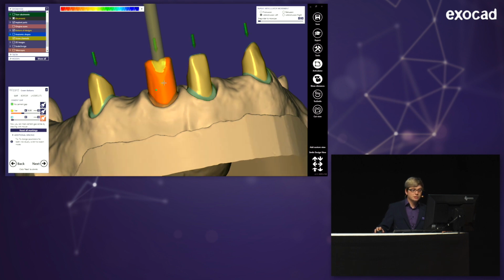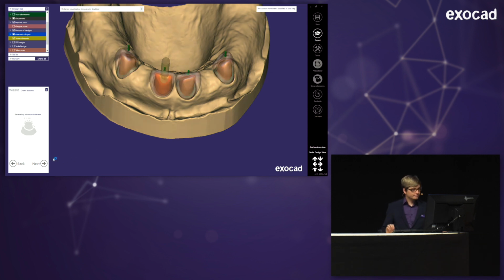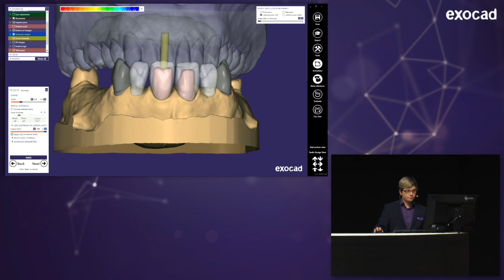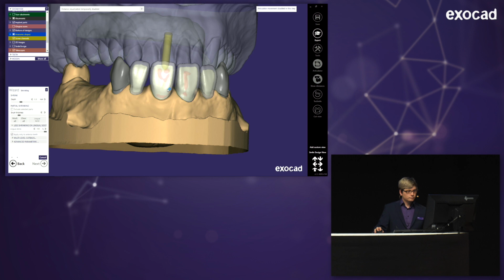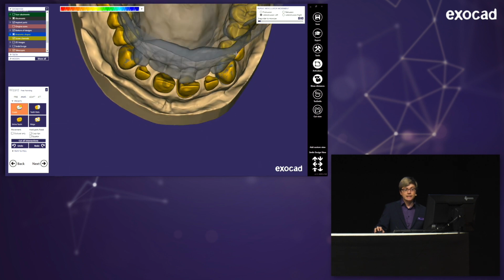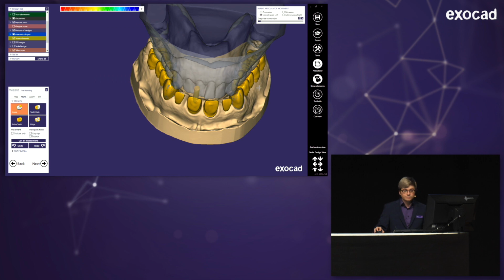And it's generating a crown bottom for the abutment as well. I could change this now, but I'm leaving it as it is. And now I can change my reduced parts, those 4 here in the front. And I'm reducing them by 0.8 in this case. And going to the next step. And you see now all the anatomical parts. I could actually freeform them right now. There's no reason for me to do that at the moment, but I could.